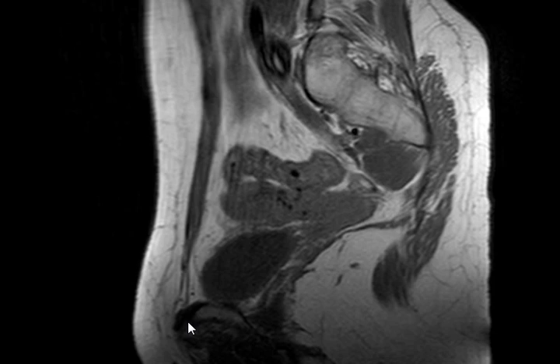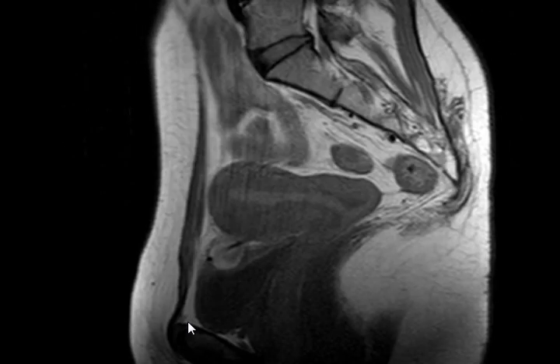What do you think is going on? It feels like a catheter. Good job. But why would the catheter go there? It's not in the uterus, not in the bladder. Okay? And it's hypointense, linear on all sequences. What would you like to ask the patient?